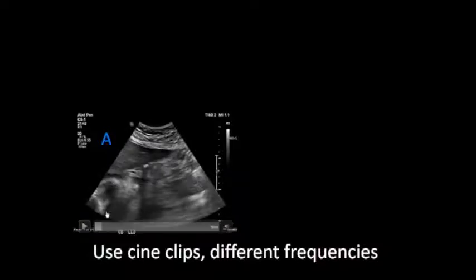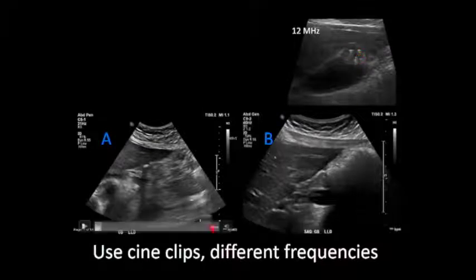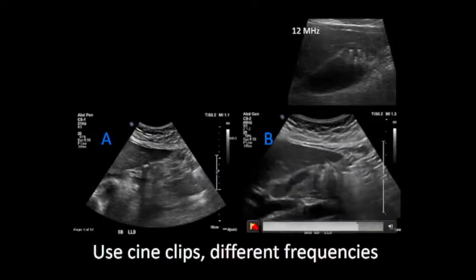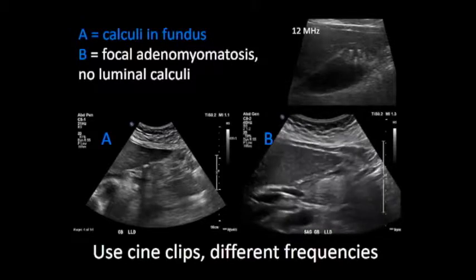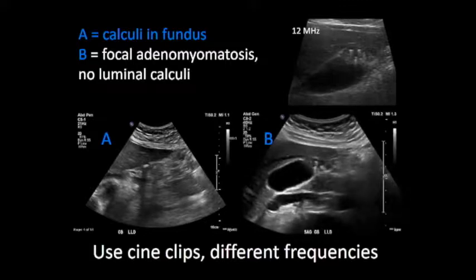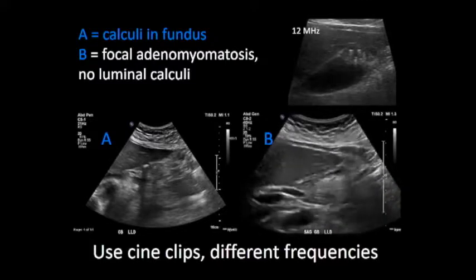All right, well, they could fall out and get into the neck. The other patient, if you look at the high res, all of this stuff was up in the fundus of the gallbladder with funny little shadows. And this one isn't going to cause the patient acute cholecystitis because this is focal adenomyomatosis, which often occurs in the fundus. And all those little crystally things are stuck up there, and unless the patient develops stones otherwise, they're not going to cause the patient any pain.